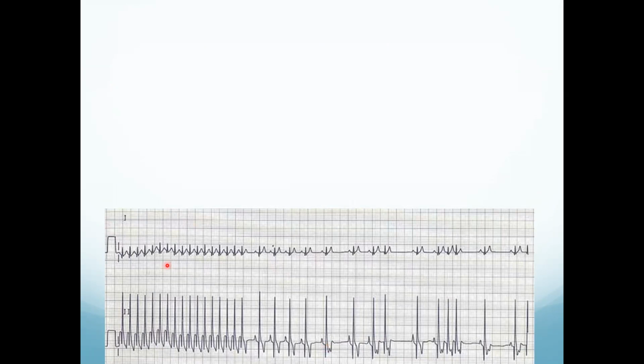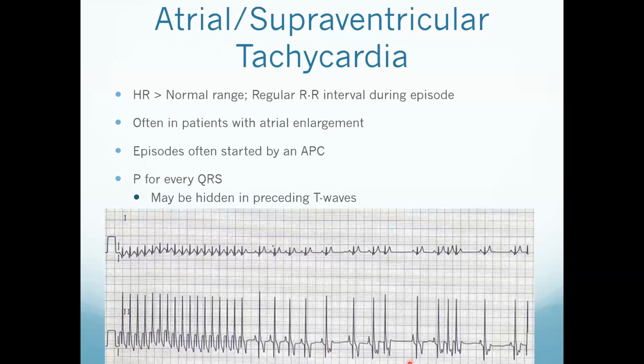So when we get runs of those together, we're going to end up with an atrial tachycardia or a supraventricular tachycardia. And so again, we've got some sinus beats that help us out a little bit because we know, okay, there's a P wave, there's a QRS, so they're all associated. So we know that this is what a normal QRS looks like. And then we look at all these rapid beats and they look pretty close. They look to be at least 90% of what the normal beats look like. Okay? But they're far too rapid. Okay, these are super, super fast here.